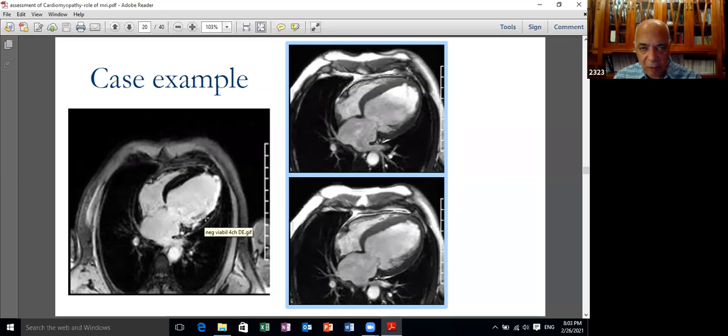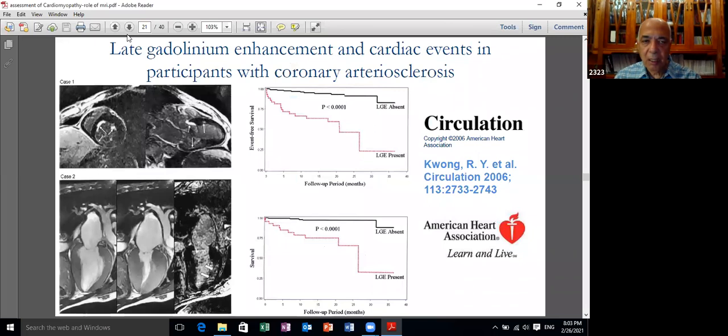So is that viable or not viable? So this was tested by dobutamine infusion. It's better, obviously, to be seen and observe the results in real time. But even here, you will find that this area remained akinetic despite dobutamine, so that it's not viable, and so revascularization will not help such kind of patient. So that's how we use multimodality imaging to come to a conclusion about the viability of these patients.